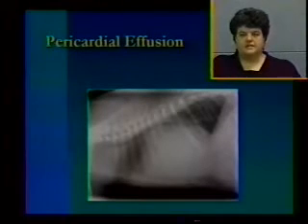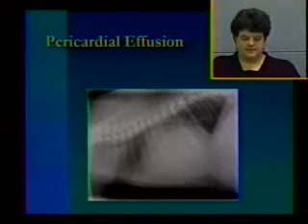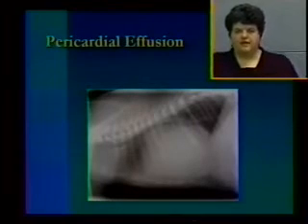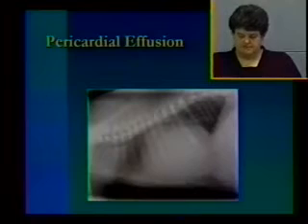The other disease that can have this appearance is dilated cardiomyopathy, particularly in the Great Danes and other giant breeds. But this is a dog that needs to have an echocardiogram sooner versus later, because pericardial effusion is a potentially life-threatening disease.